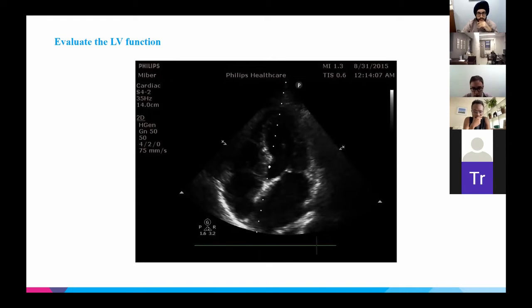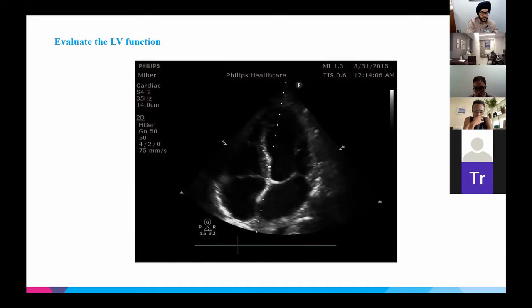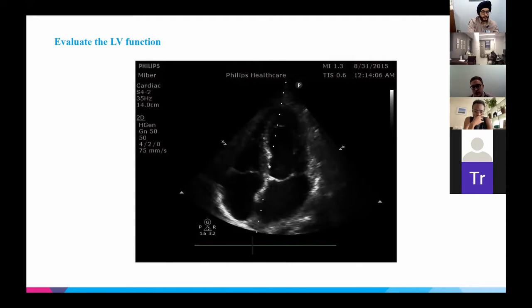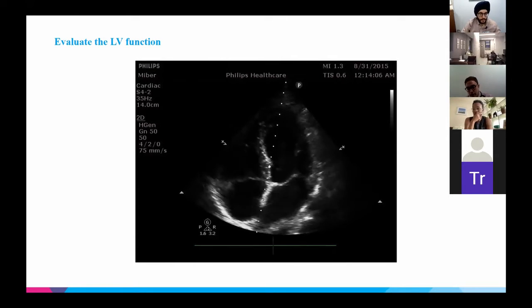All right, so 23% normal, 49% reduced, and 28% severely reduced. Okay. As you guys get more and more comfortable with doing this, I think the hardest determination is that it's easier to see the extremes than the not extremes. So the answer to this one I can say is that it's mildly to moderately reduced.